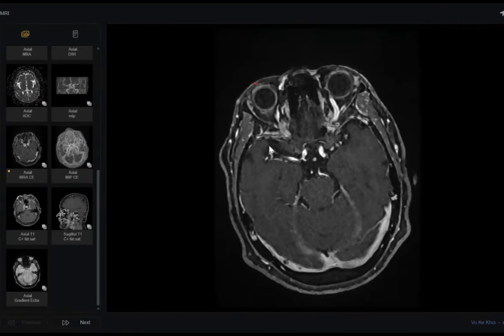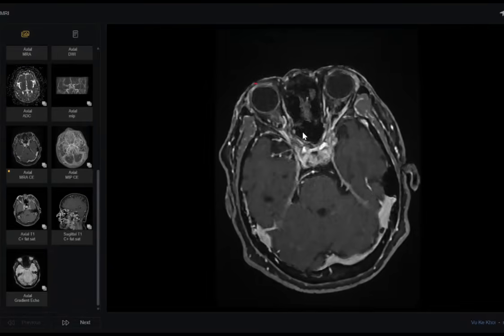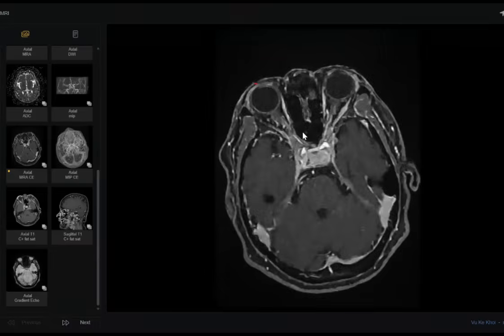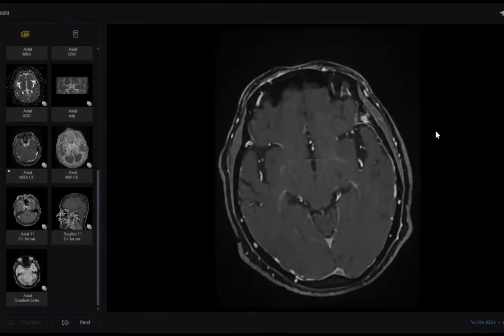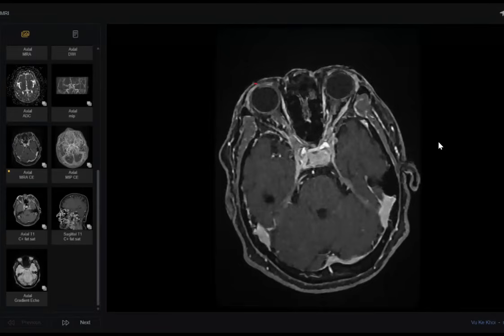Sir, can I please scroll? Okay. I'm looking for any arterial defect.